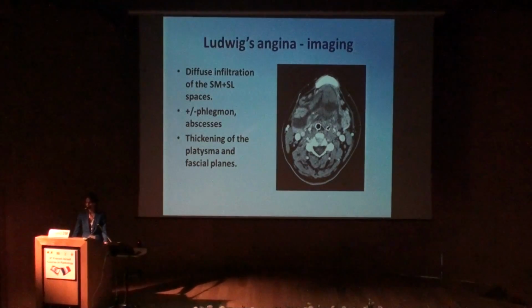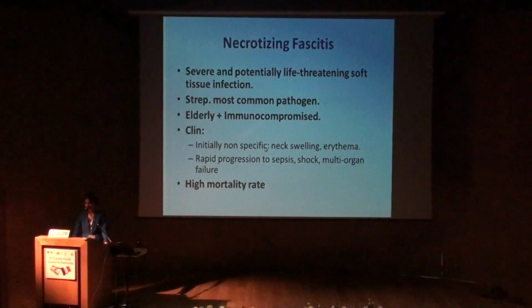And this is a case from the literature, with diffuse infiltration of the submandibular and sublingual space, and with a fluid collection, maybe of an abscess, and thickening of the platysma and fascial planes stranding.